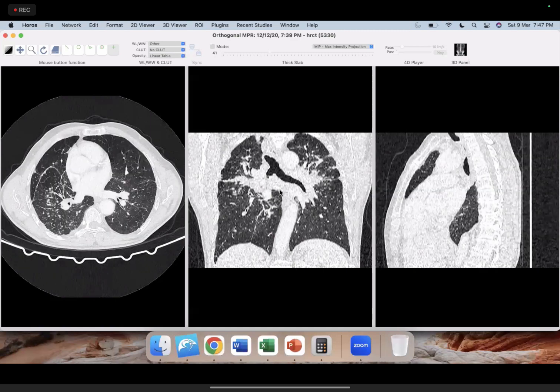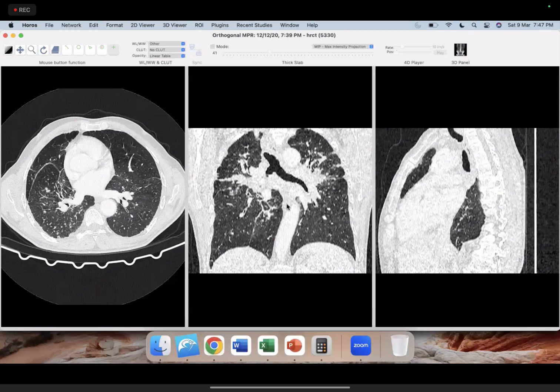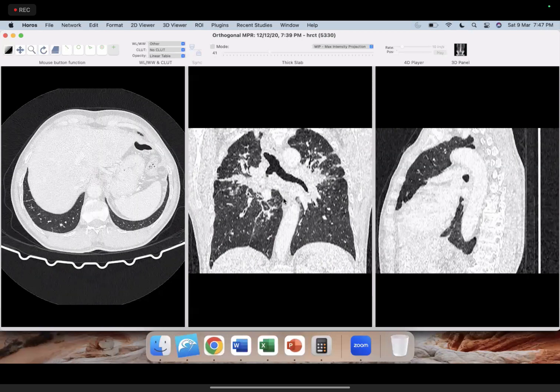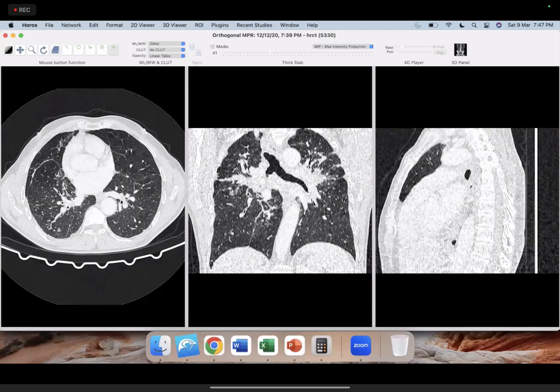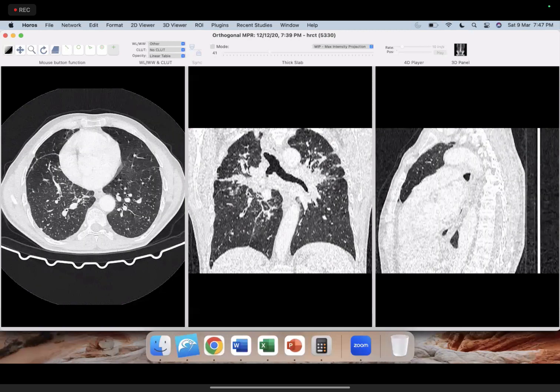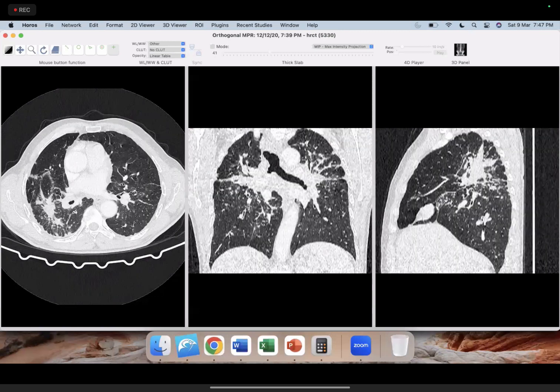So, what do we think? See the rest of the lungs. There you don't see anything else. You see again a nodular lung disease. The ones, for example, that we saw earlier are the HP and the sarcoid. So, what do you think of this distribution? So again, this looks like a little bit of a random distribution, but notice how the nodules are. They look very dense compared to the previous example where they were kind of ill-defined or not so dense.